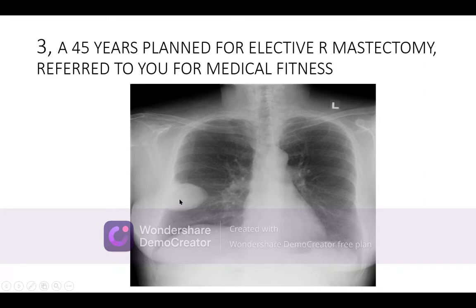Then further you go to the tumors and tumor-like states. Yes, there is the possibility of a tumor which is arising from here, a benign tumor, a bronchial adenoma, or a hamartoma, or any other malformation type of benign tumor is possible.